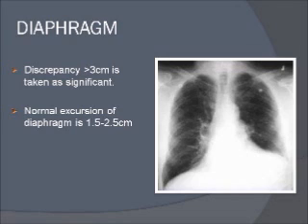And normally the diaphragms during inspiration and expiration move about 1.5 to 2.5 centimeters. And this is also useful when we evaluate cases of diaphragmatic palsy. Then sometimes we take inspiration and expiration views to compare the movement of the diaphragm. So this information is important.